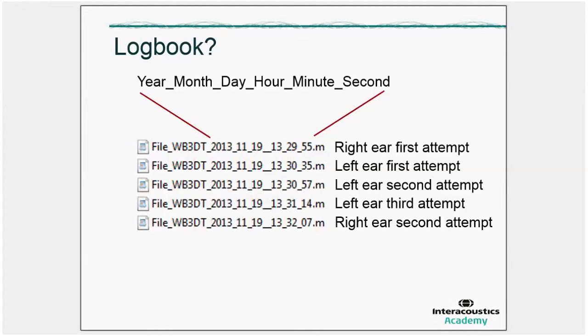Because usually it's only one measurement on the left ear and one measurement on the right ear that we keep. If it is not the last measurement of the ear that has to be kept, then people need to keep a logbook to keep track of which files need to be included. If you always keep the last one, then it's relatively easy within Excel to filter out and to hide or delete the earlier measurements on the same ear of the same patient.